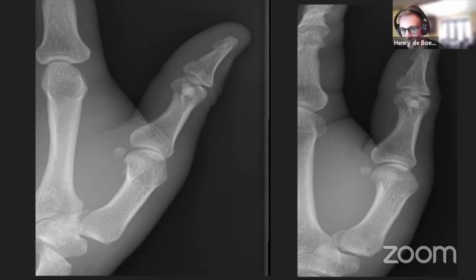So avoiding ones with much degenerative change, because whilst that's probably reflective of the real world, it's more difficult to learn when there's superadded degenerative change. I wanted to focus on the fractures and the alignment. So the bone density is probably normal because they're mostly young patients.